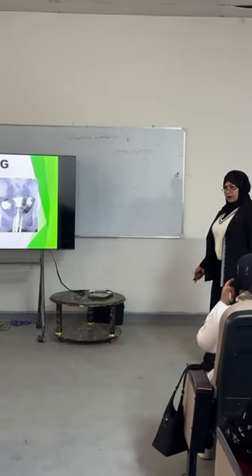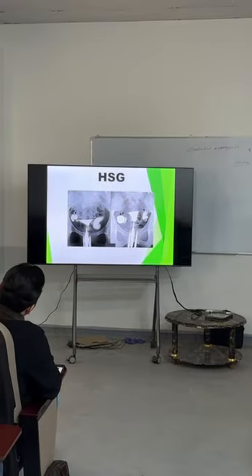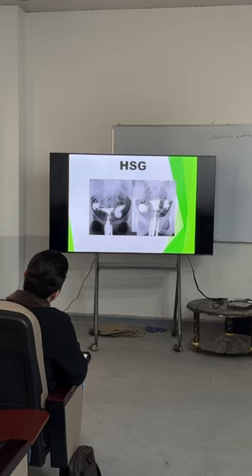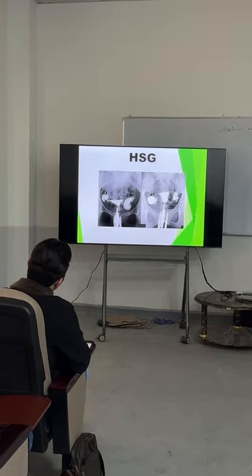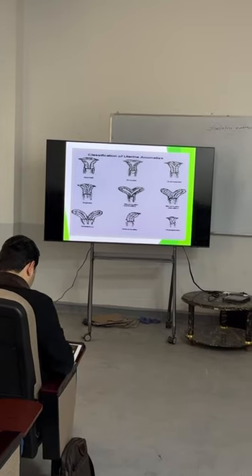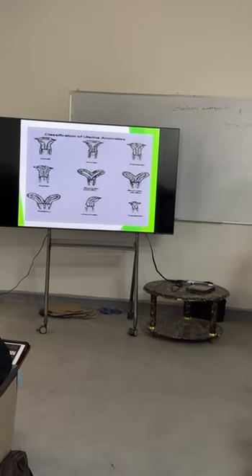This one, there is no spillage. It is suggested for bilateral, no spillage, distal dilatation of both tubes, suggested for bilateral tubal obstruction. This is the anomaly of the uterine cavity, you know about it?